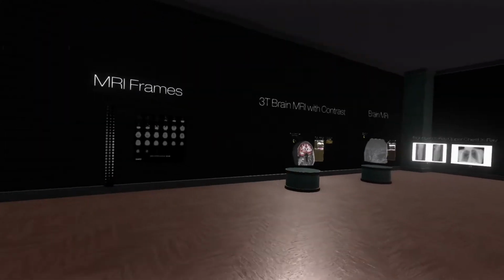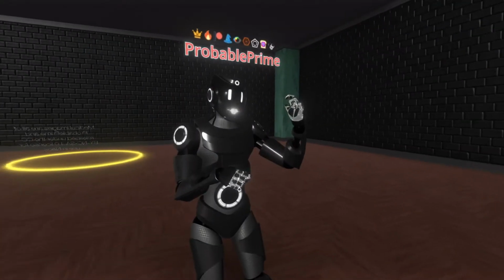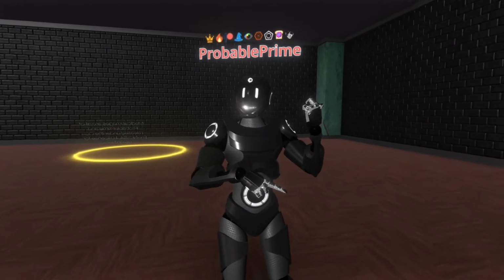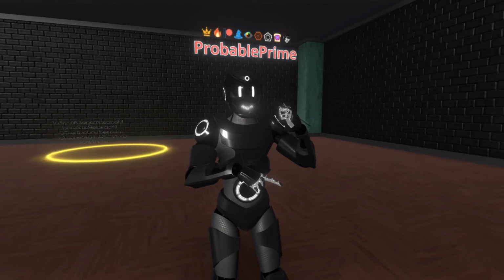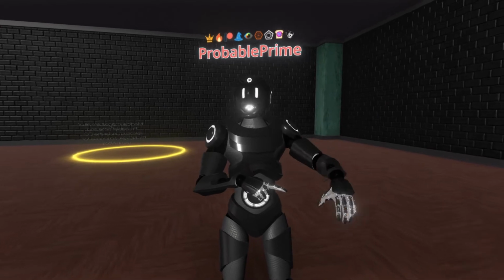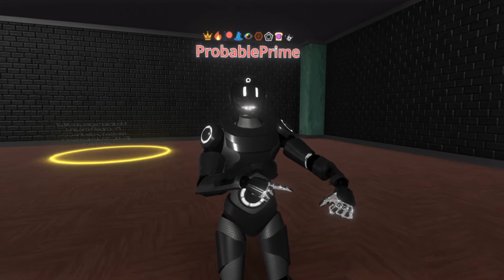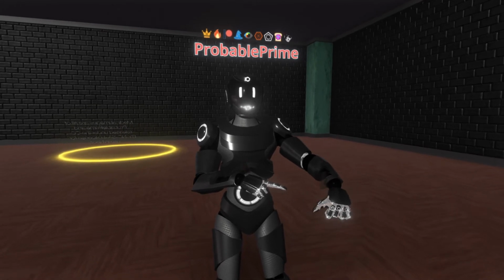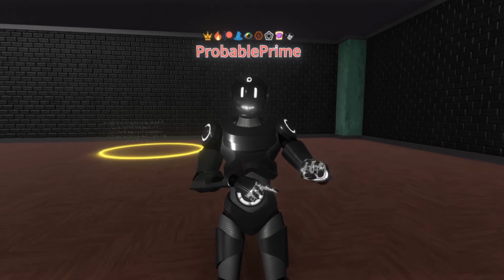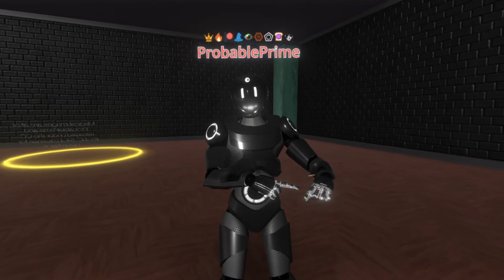That's it for the medical world as it currently stands. I'm working with several other friends, colleagues, and in some cases patients on various other types of scans. When working with them, we have to maintain their privacy, whereas these are all of me, so I can give them out because I own them, they're of my body, but I am requesting the abilities and the license on those as well. We've got a lower abdominal MRI and a knee MRI as well, and I'm trying to get permission to showcase those in this world. Any other medical scans I get will be showcased in this world.